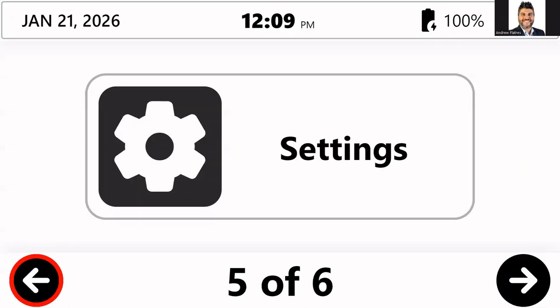And I wanted to highlight very quickly the settings, again, because we have some that are new to the interface. Right now, I'm in full color mode with black text on a white background and colors in my icons. So those are some things that might need to be adjusted to make for a comfortable user experience.